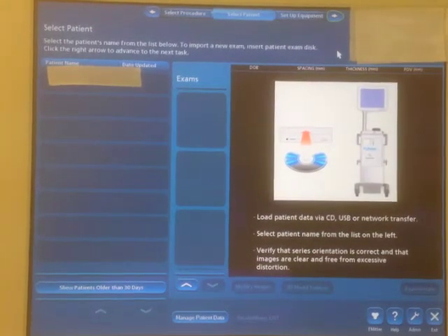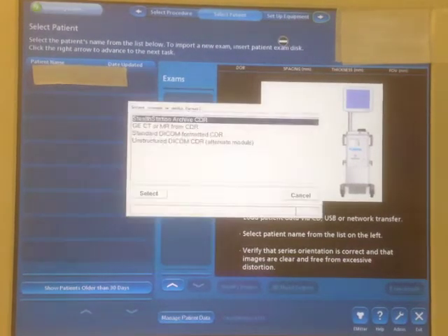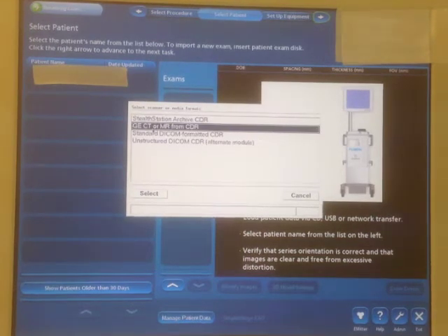We have just inserted a CD which will auto-run if it is in a correct format. It requires DICOM formatted uncompressed images. Occasionally we have had problems with viewers being on the disc, however this has not normally been the case. Import options will pop up on the screen after the disc is recognized. The import options are shown.